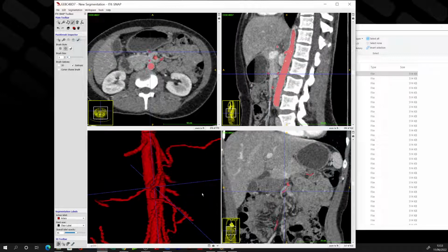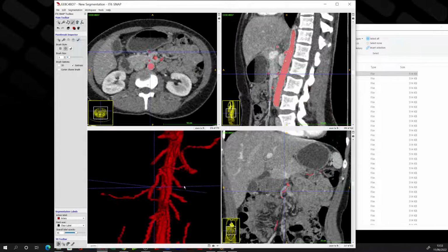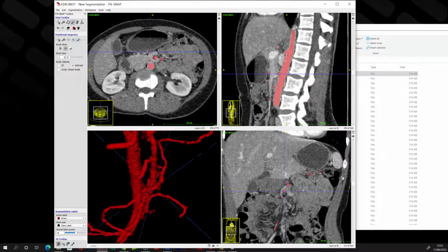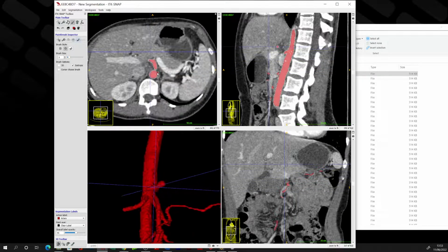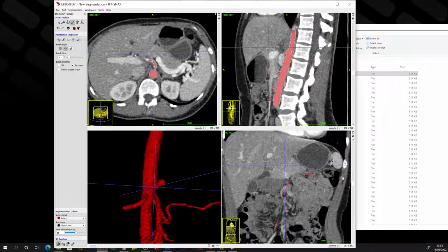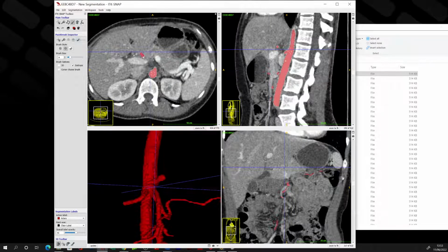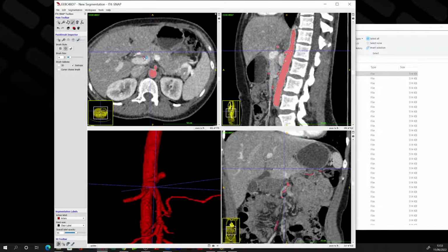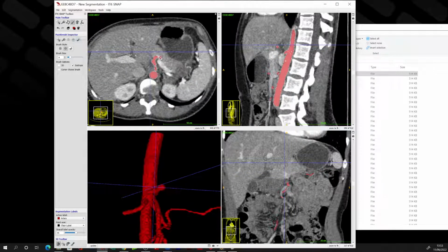Okay, I think we've probably done enough now on the arterial vessels for the time being. We can probably go back and just add in some of these celiac ones, especially within arterial segmentation, where this is actually quite easy to do because they're very well enhancing.